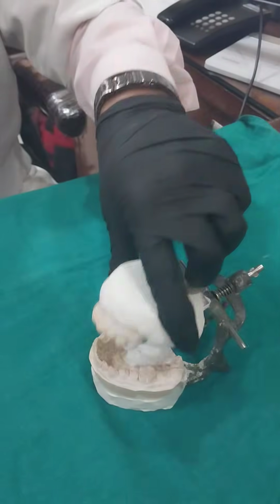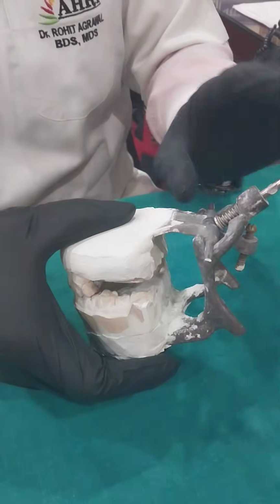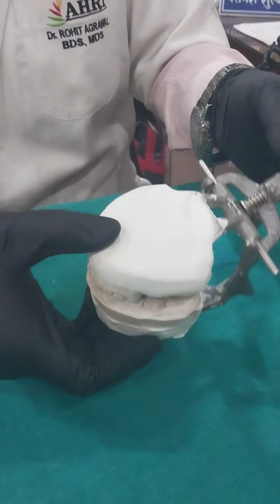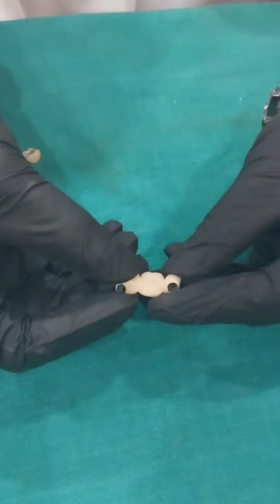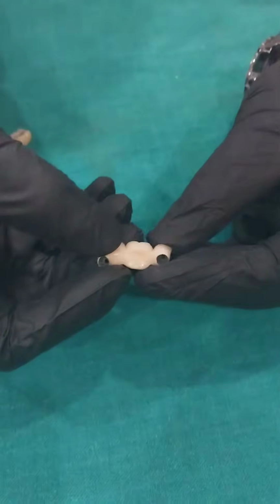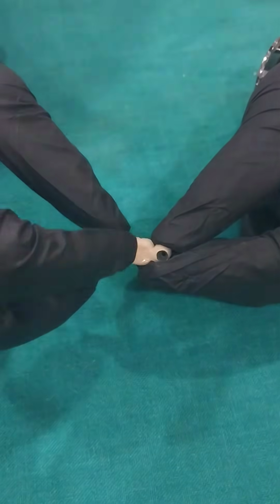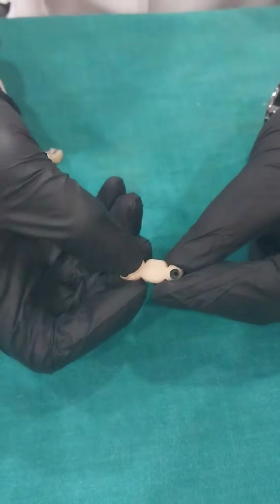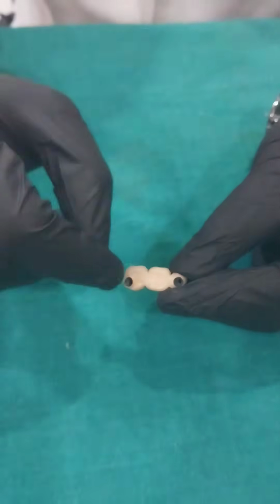First of all, from the photograph of the articulator alone you can make out this is poor lab work. This is the hinge articulator, which is now extinct, but still these labs are using it. So this is one point. Now look at the prosthesis. Extremely concave intaglio surface, like a bowl. So this will definitely have food lodgement. That shows this is poor lab quality work.